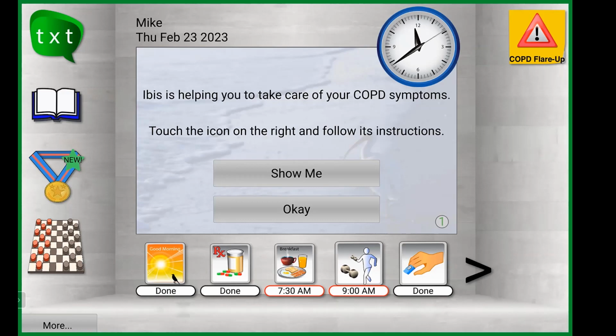Now, lastly, Sean, I'll just cover, because it's on the screen and maybe your eyes have wandered. Of course, what good would a piece of technology be without some games? That little checkerboard icon on the bottom left. We have a rewards program for our users captured in that medal that you can see on the left bar.